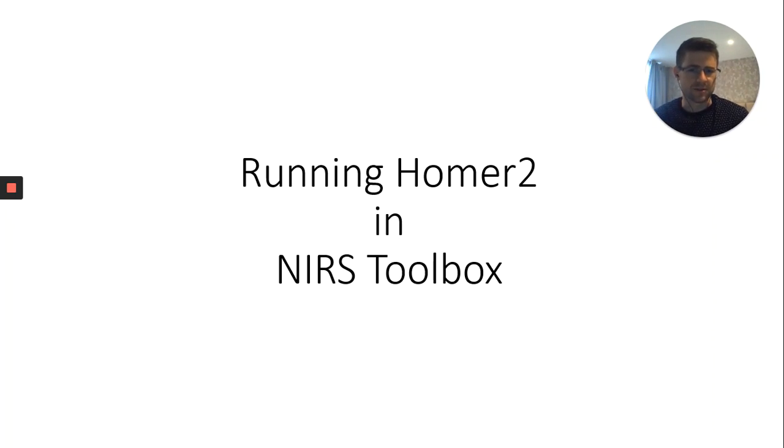What's pretty nice about the Toolbox, though, is that it actually allows you to use outside toolboxes. So if you want to use Homer2 in the NIRS Toolbox, you're welcome to do that. But it's not quite as straightforward as you initially expect, seeing that Homer2 offers built-in functions to be called in the command line or in a script in MATLAB. So does the NIRS Toolbox.